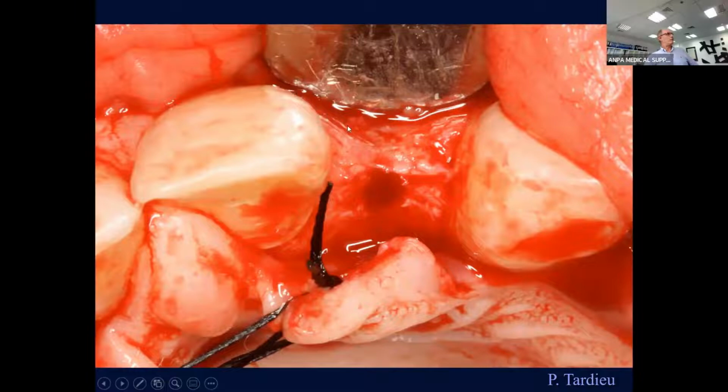So I have been planning. So we talk about the planning. You see the bone is like this. It's concave instead of being convex, okay? So as long as we've been losing bone there, we cannot put the hole here. It will be too much outside and the metal will show, or we will not have enough connective tissue on the buccal side. So because of that, I change from the middle, I go more palatally. And this is what I ask you to do when you are planning implant. If there is a little more resorbed bone on the upper, go palatally and try to emerge at the high level on the buccal, but start palatally.